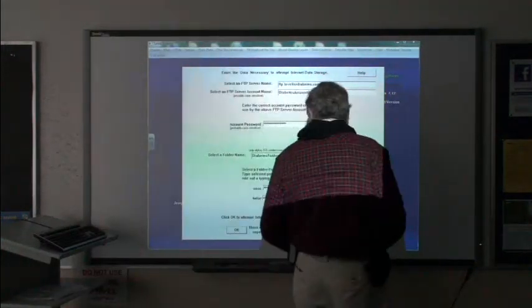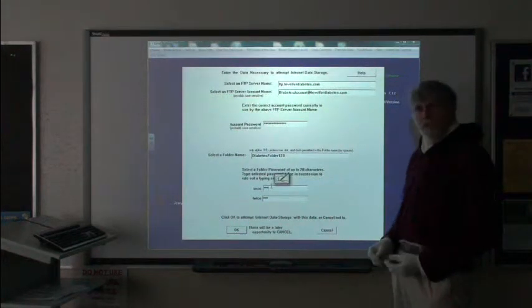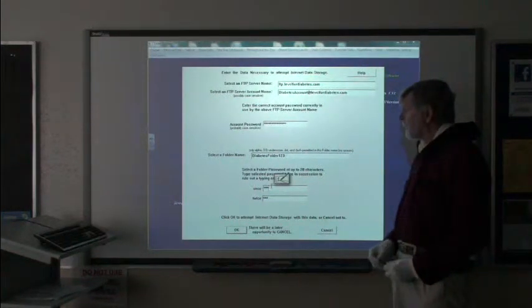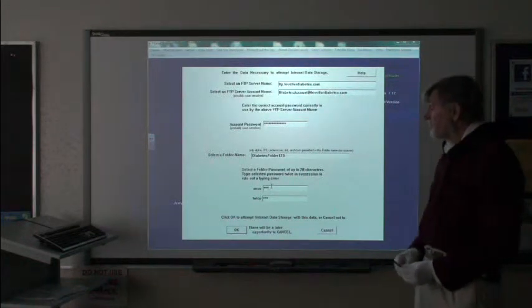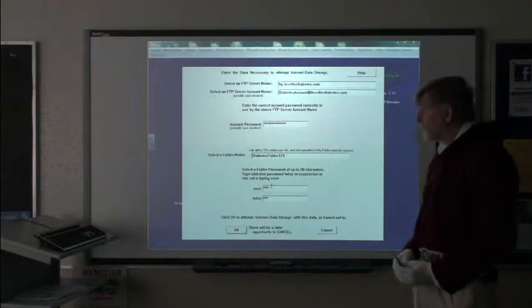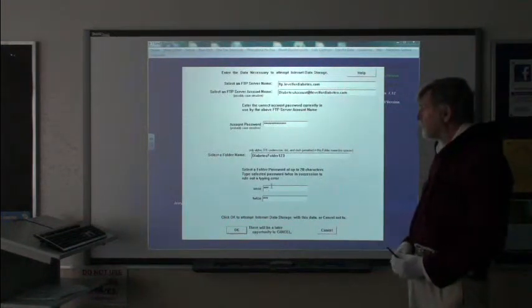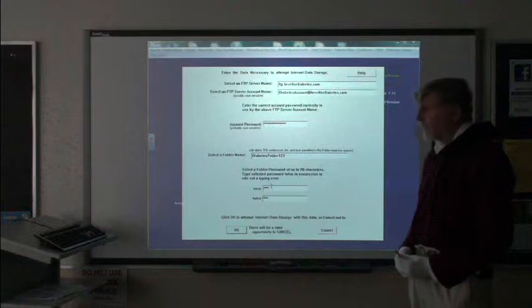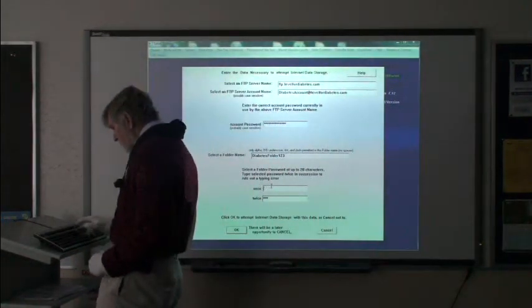And then he and I have discussed together what would be a good password to have applied to this folder. And in his version of Level for Professionals, he indeed might have already applied it. So between the two of us, we have decided what password we would use for this diabetes folder. And of course, no one else will know it. So I'll type that in now.